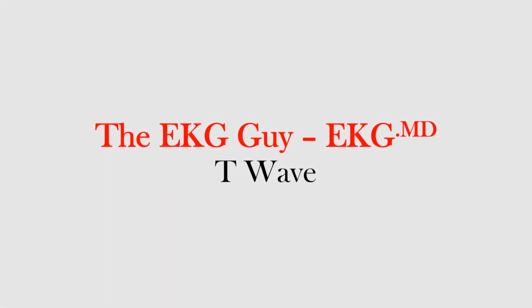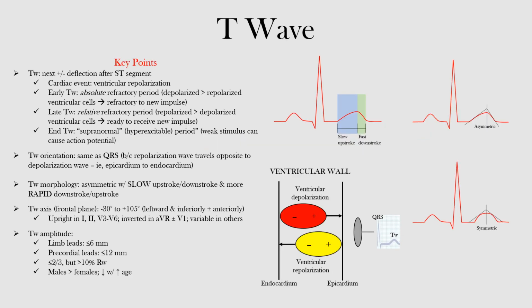In this lecture, we will discuss the T wave, specifically what it represents and how it should normally appear on the EKG. The T wave is the next positive or negative deflection after the ST segment, and it represents ventricular repolarization. So if you look here, we have our T wave.